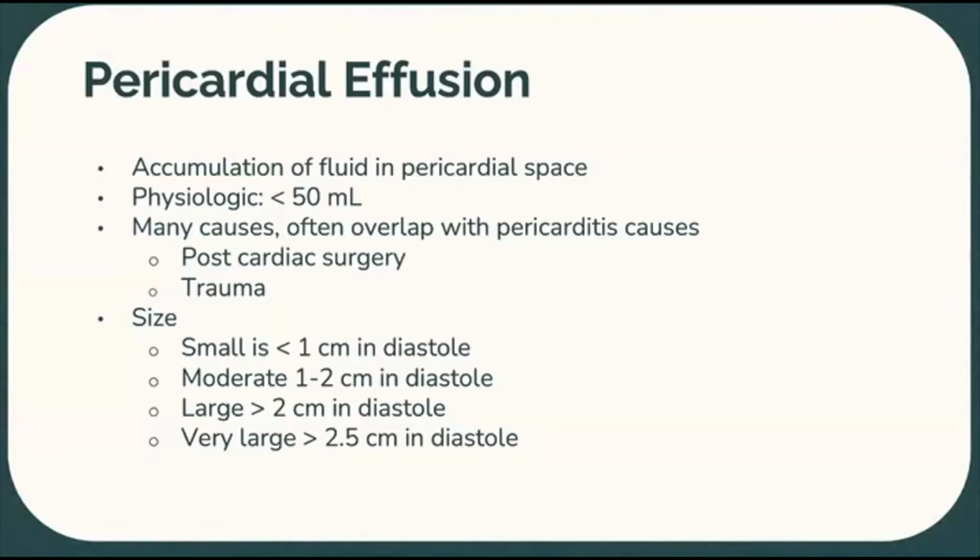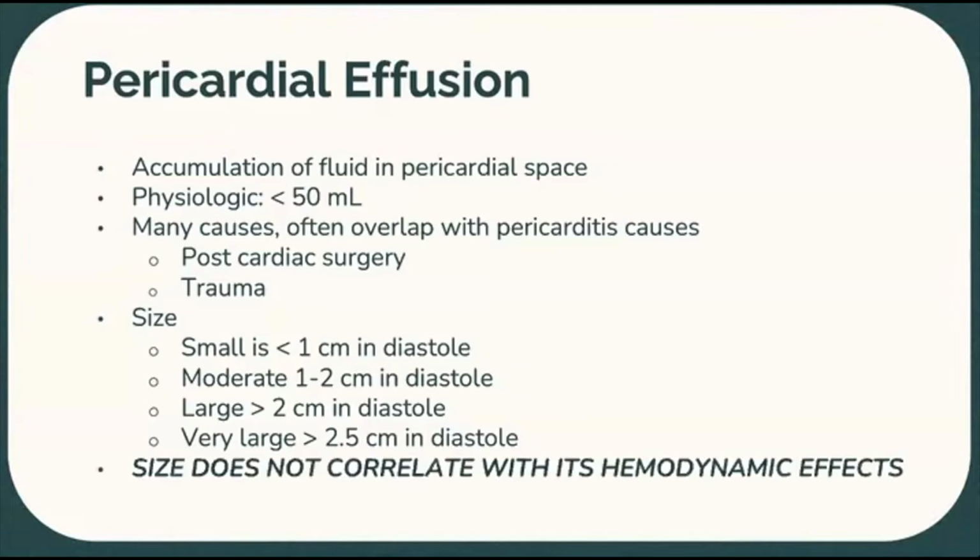I've heard trace being described as when you can only see the effusion in systole, when the heart is contracting and therefore at its smallest, but I couldn't necessarily find a very specific measurement for that. Something I just wanted to highlight is that the size of the effusion does not correlate with the physiologic effects that it might exert.